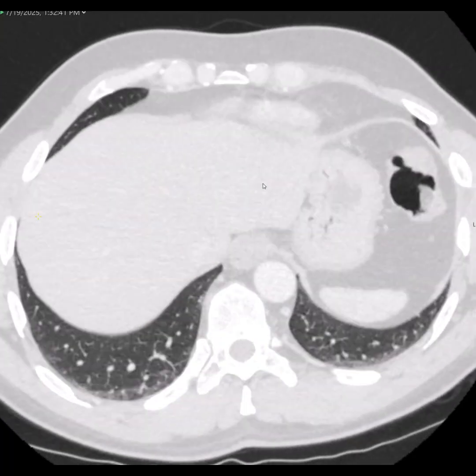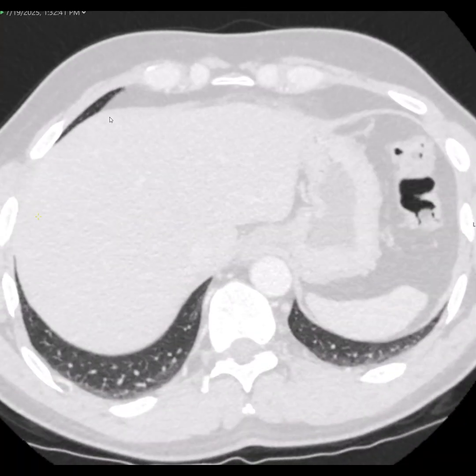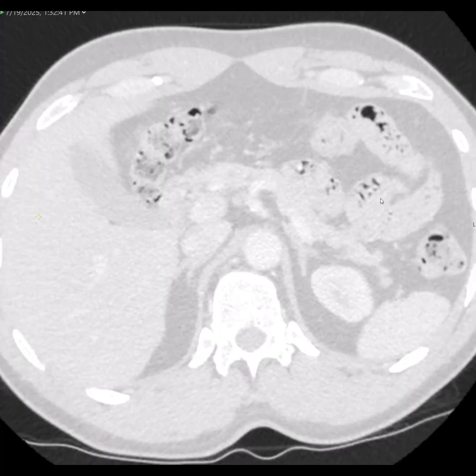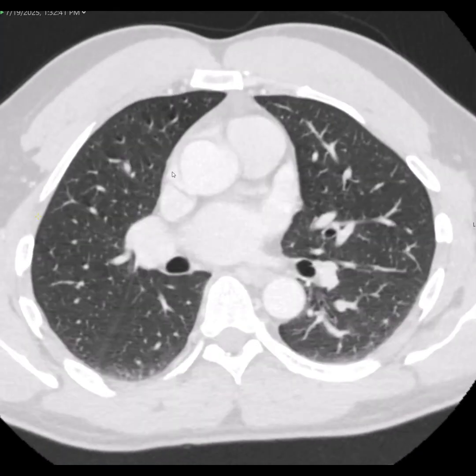And while you're in the lung window, you want to quickly scan the abdomen looking for any free air, because air is best seen on the lung window. Switch back to a soft tissue density and look towards the axilla.